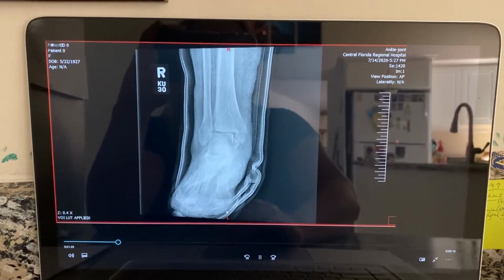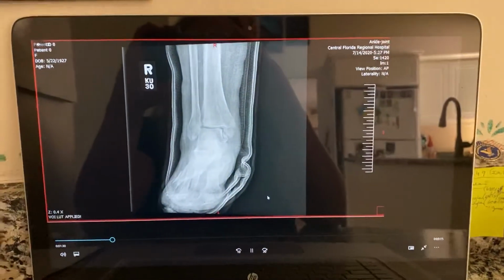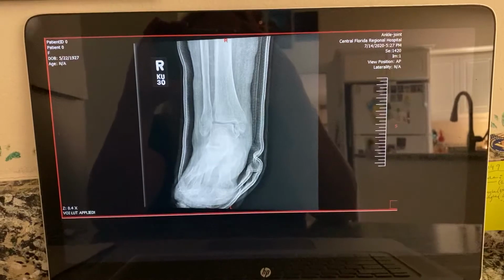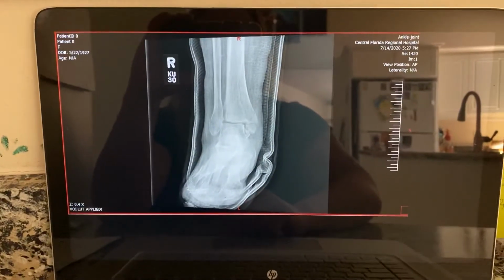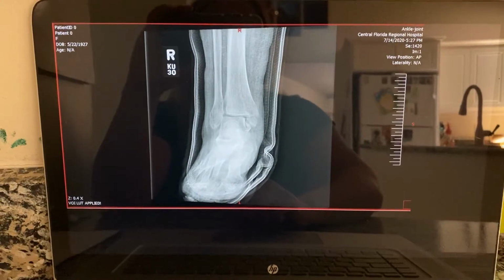Technique used was AEC, 65 kVp at 1.58 mAs, with a negative 1.3 reading in the green. The cast would require a slight increase and could have increased the receptor exposure.